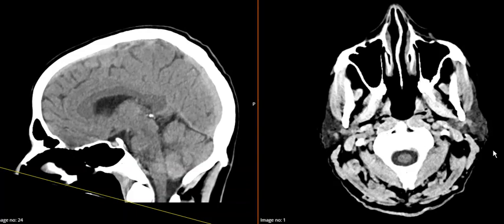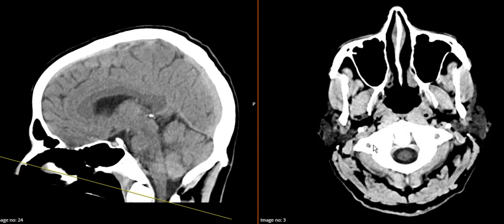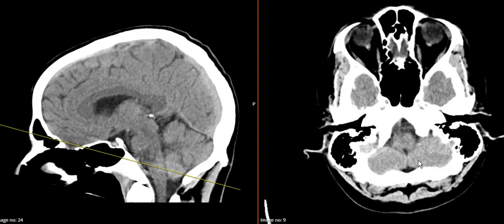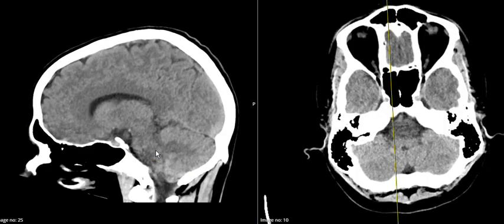Talk through a CT brain of somebody with stroke-like symptoms. This just tells us where we are, and we're going to start at the bottom and work our way up. So you've got bones outside, so cervical vertebra, spinal cord coming up through the foramen magnum, medulla, the cerebellum at the back, and you can start to see we're coming up into the pons.